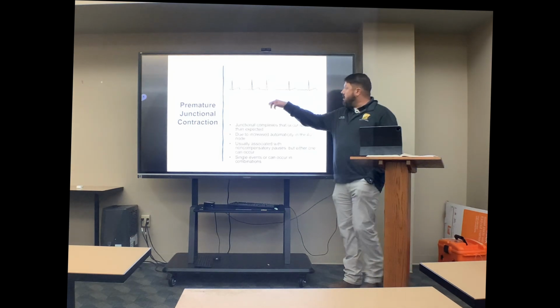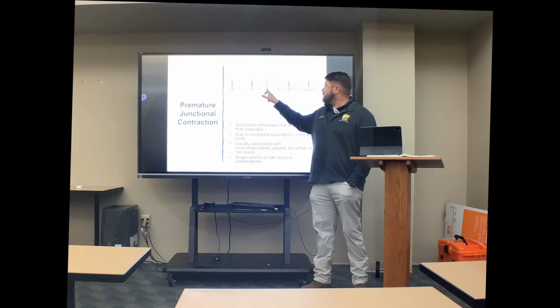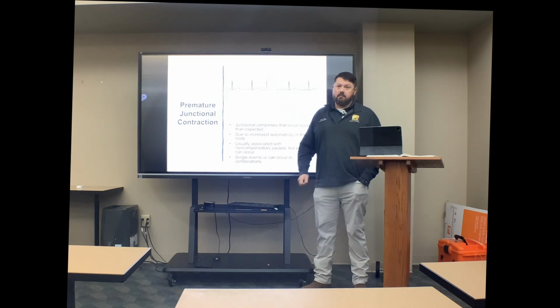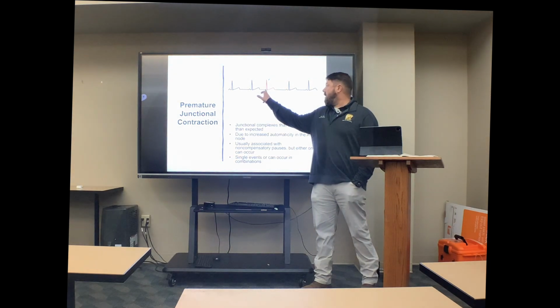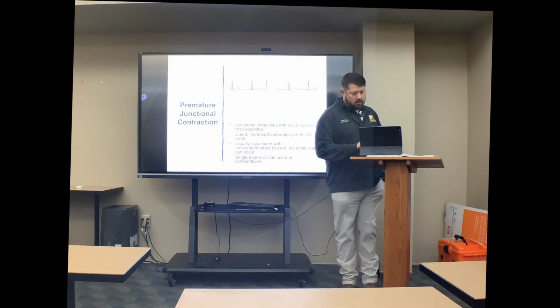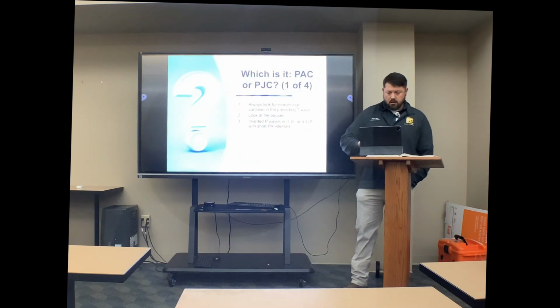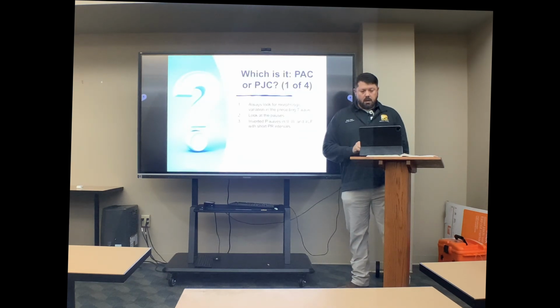So we're trucking along, then suddenly we've got this complex. Now notice, what does the QRS look like? Same. It's the same, right? Because there's no issue with the ventricle right now. But what do we not have? P wave. All right.